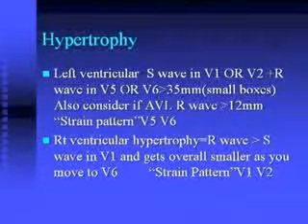One hint is whenever you're given a choice, such as an S wave in V1 or V2, or an R wave in V5 or V6, always pick the largest wave.